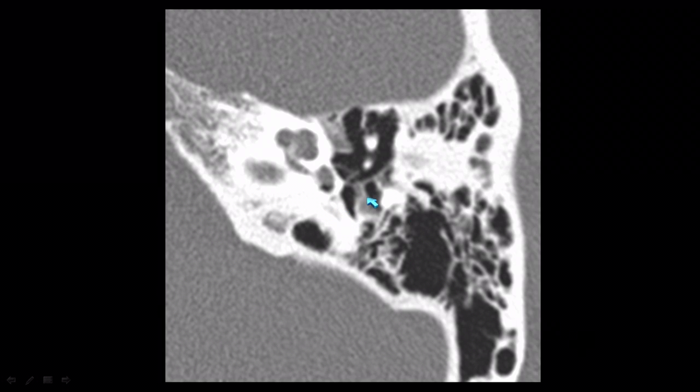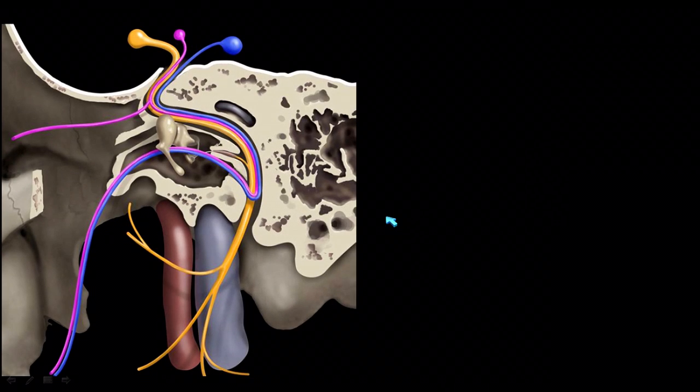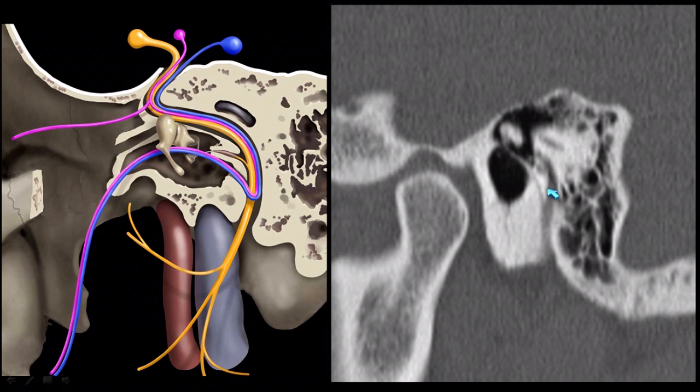If we look very closely, we can see other structures around it. Sometimes if we look at the posterior descending mastoid segment, we see the soft tissue and the pyramidal eminence where that little stapedius muscle is coming over. We see here nicely the anterior and posterior crura of the stapes. So we have a little branch coming off the descending or mastoid segment going anteriorly. And again, when we think about all those little fibers and the different functions of the facial nerve branches, we can sometimes see little branches as we come off. So here's that chorda tympani making that sharp turn, strangely, off the descending mastoid segment as those fibers come down and the special sensory fibers turn around and come up to go through the middle ear cavity.